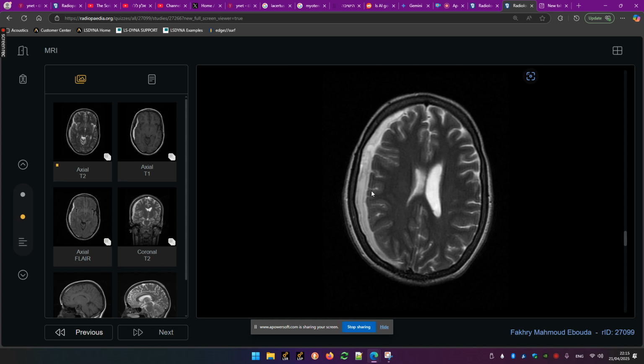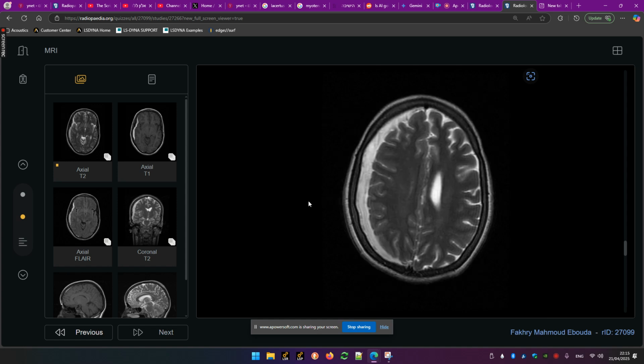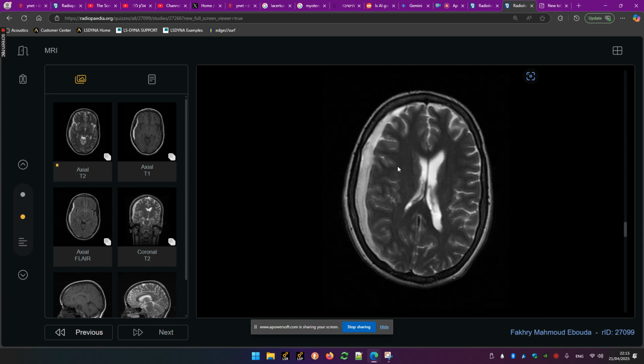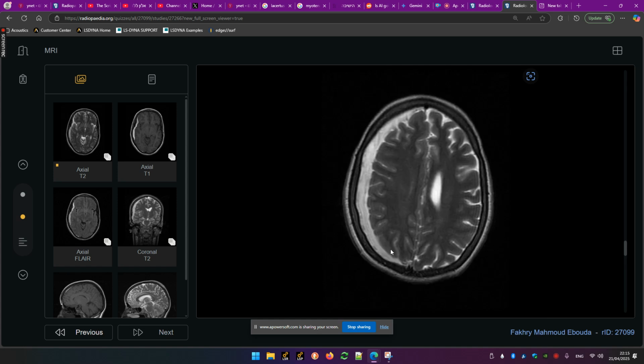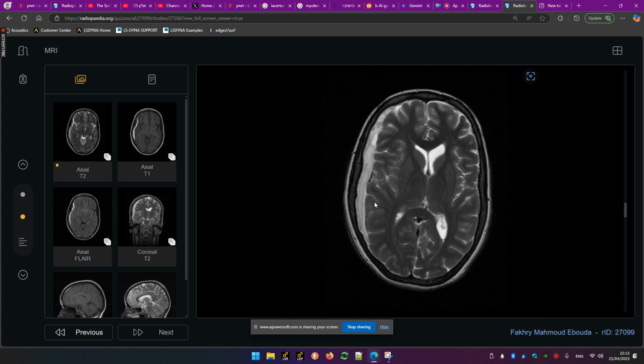You see that it's subdural and not epidural and not subarachnoid, because epidural would look different, and epidural should not cross sutures. There is some suture right over here, right? I think there is something, and this subdural goes throughout it. Epidural wouldn't do it. Okay, anyway, this is like half of a moon.